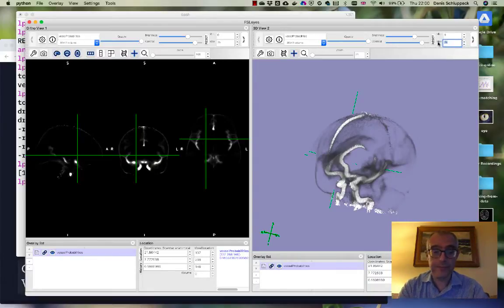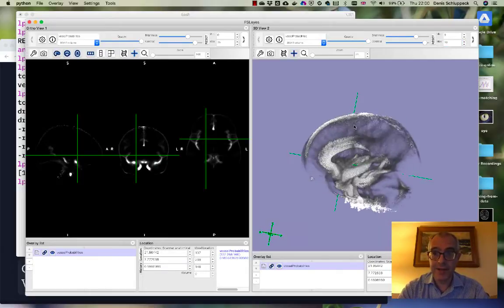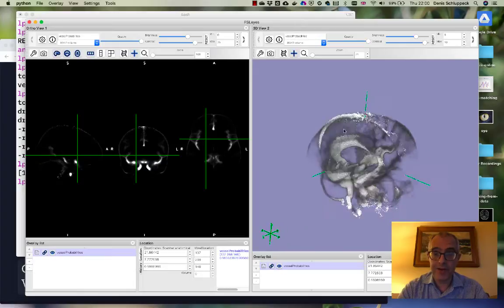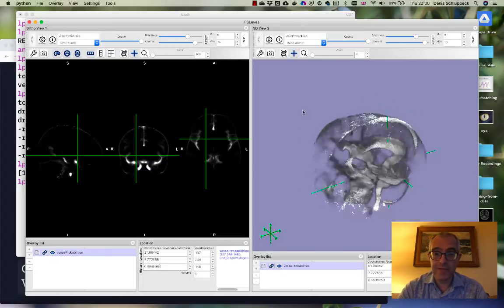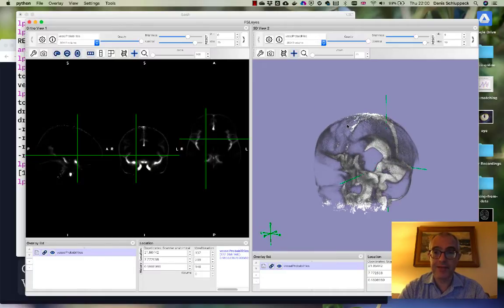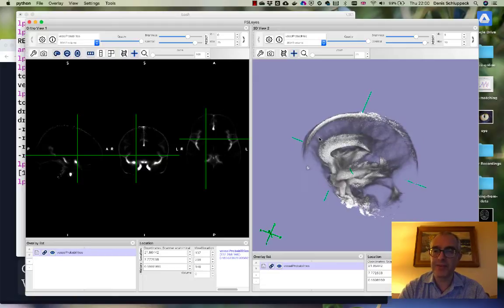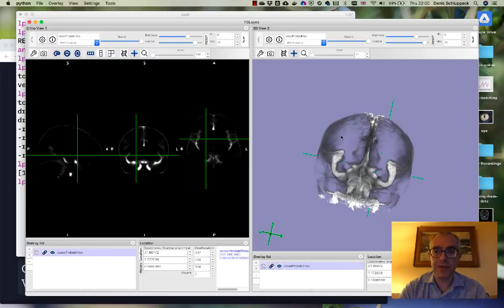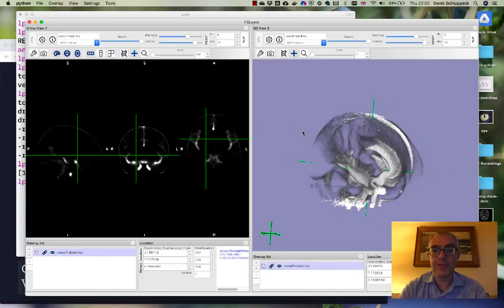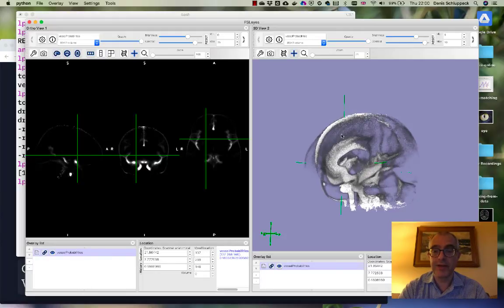And so if I change this to 10, you can now see all of the areas in which there's an at least 10% chance of hitting, essentially. It was one way to think about it. I guess I don't know whether it's exactly the precise way a statistician would think about it, but where there's sort of a 10% probability of hitting one of those blood vessels if you were in a new image, okay? And so now you can maybe also understand why those areas will become bigger, right?